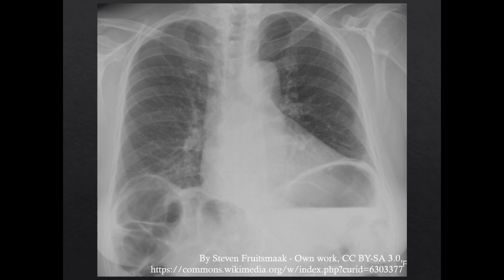Now, in addition to this often having a small amount of air, which can make this a subtle sign at times, there are also a couple of things that you need to be aware of that might trick you if you aren't aware of them.